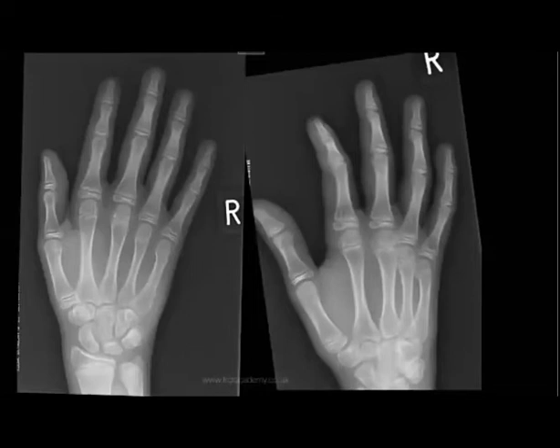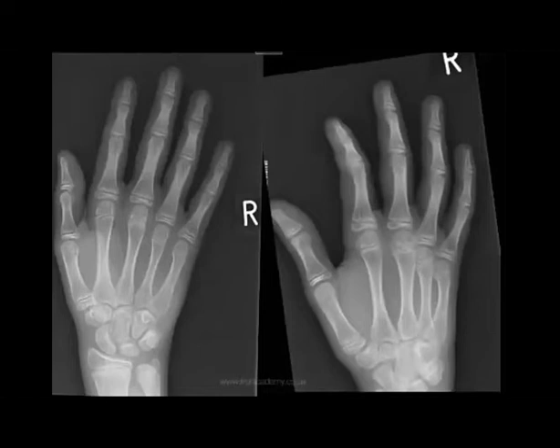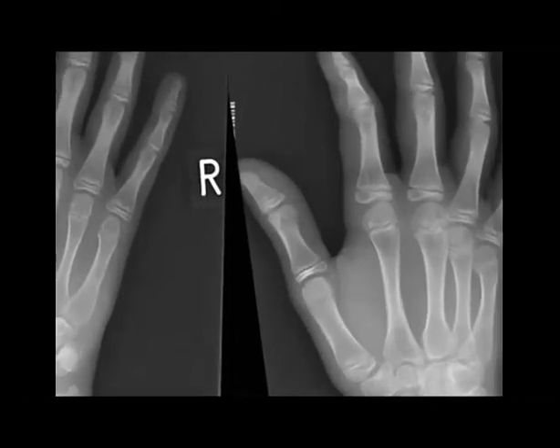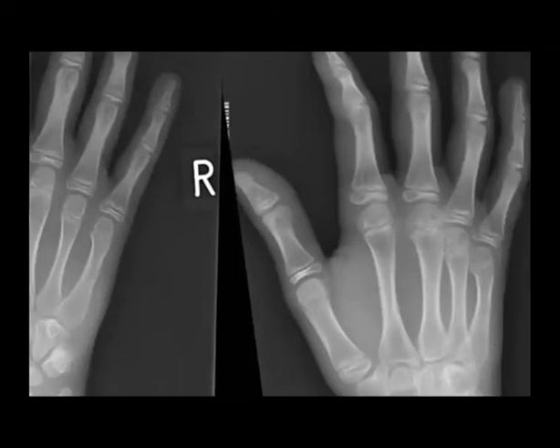In the hand, this is one of the difficult rapid reporting images, because it takes a bit of time, as you need to zoom in bone by bone and try to find the abnormality. But for the training, I will help you find the abnormality.